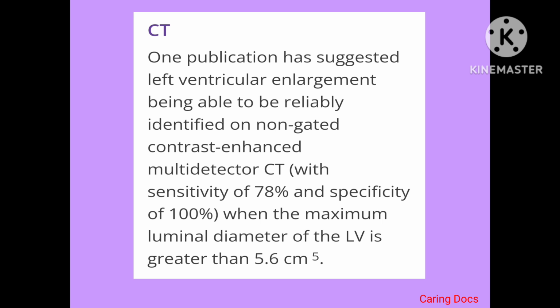We have to consider two criteria, voltage criteria and non-voltage criteria, to make a diagnosis. In voltage criteria, the most commonly used method is the Sokolow-Lyon method, and with this we have to take into consideration non-voltage criteria also, that is R-wave peak time more than 50 milliseconds or LV strain pattern. If the ECG shows these changes, this is not confirmatory that the patient has left ventricular hypertrophy. To confirm that, we have to do 2D echocardiography.